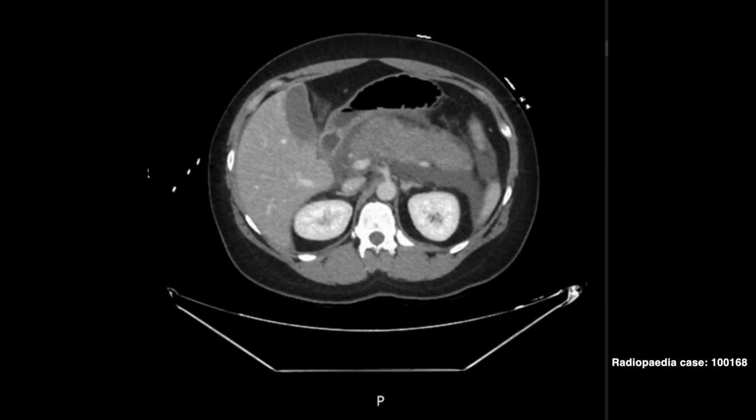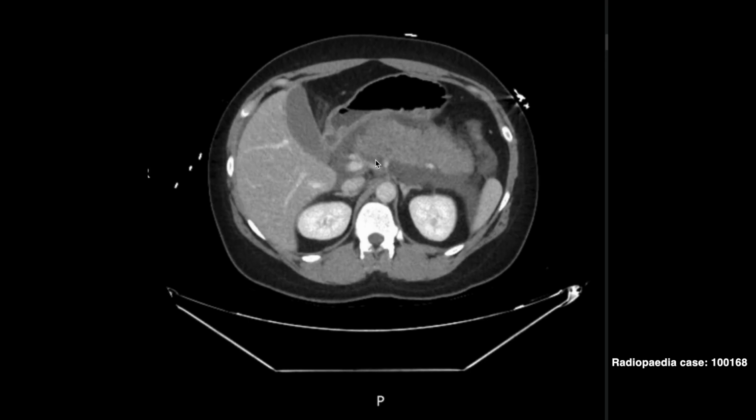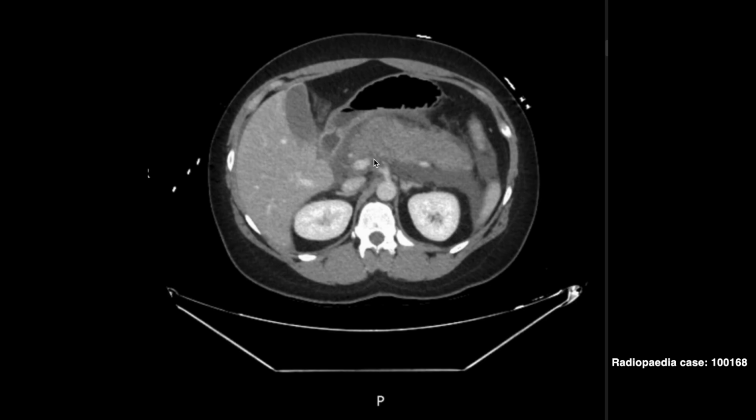So here is our patient, 32 years old, epigastric pain, amylase of 1800. Let's look at the CT. The first thing I always do, I go straight to the pancreas on the portal venous phase. Is it swollen? Yes, look at that. The whole gland is plump. Normally you would see a nice tapering from head to the tail. Now the critical question, does it enhance? Look at the portal venous phase.